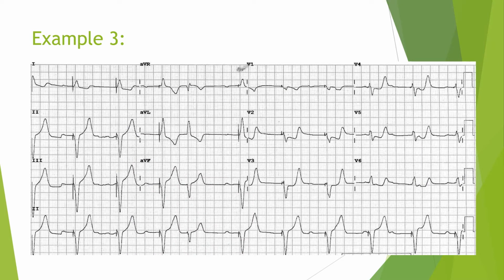In example 3 here, you have a ventricular pacer rhythm, and that's commonly taught to just throw out, that you don't even give a second look at it, that it's just chaos, you have no idea what's going on. And so if this patient was having chest pain, you would have to transport and wait on troponin, sometimes a serial troponin. And remember, in an acute MI, troponin is not the first cardiac enzyme that elevates, it's just the most sensitive, that's why we use it. And so it can take hours and hours before your troponin pops. And so in this case, if you were to not activate, if you were to sweep this under the rug, the patient could be infarcting for hours before you identify it.